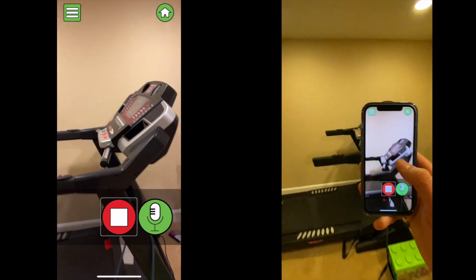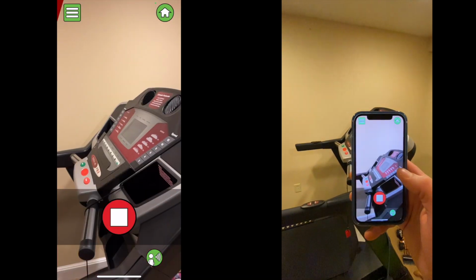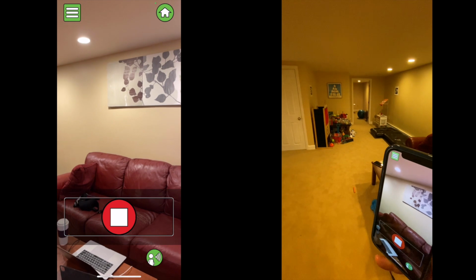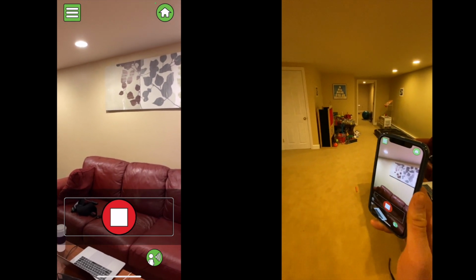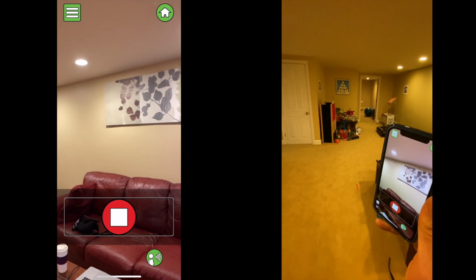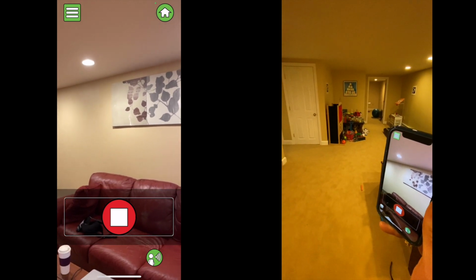Okay, so I got to the other end and hit pause. Now I'm going to start navigation. Correction for phone and body offset will be updated as you start walking. Now I'm turning my phone to a 45-degree angle to the route. Right now I'm not getting any feedback because my phone is not facing in the correct direction. But as I start to walk, the device will sense that it's misaligned, that the orientation of the device is misaligned with the direction that the person is moving, and correct for that offset.